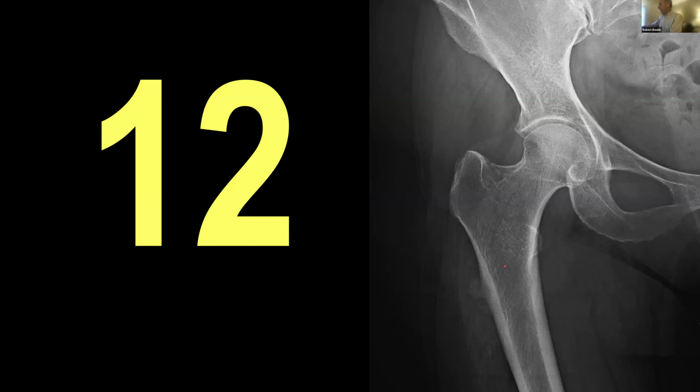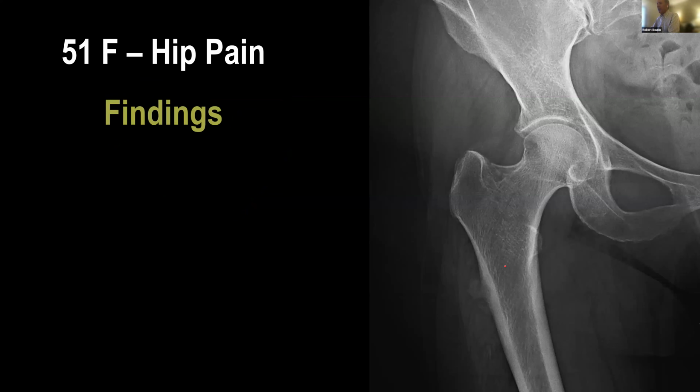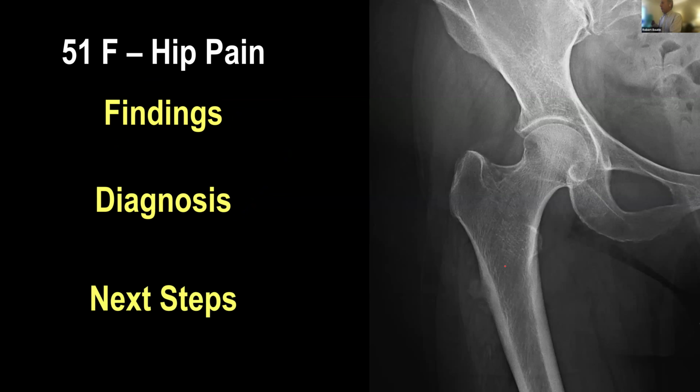All right. I think we're seeing a lot of cases, so hopefully you're having as much fun as I am. Here, another AP radiograph, this time a 51-year-old woman. What are the findings? What's the diagnosis? And what might you do next?